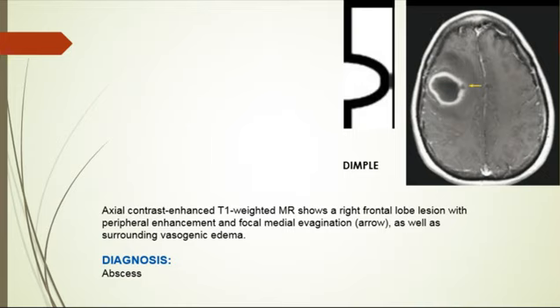What do you think? This could be tumefactive MS, but the pattern of enhancement is much more in favor of abscess. Okay. Infarction does not present as a cystic lesion. It does not present as a ring, cystic, or rounded lesion.